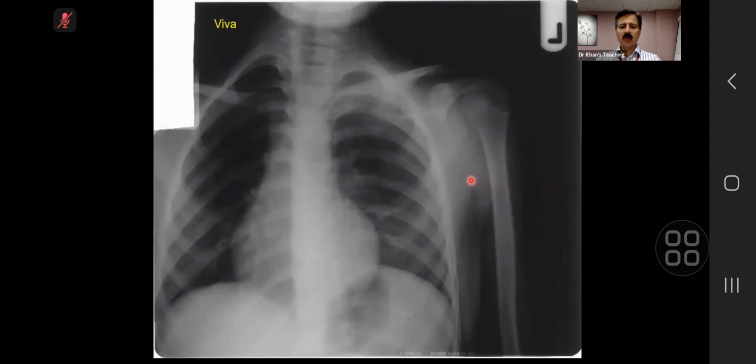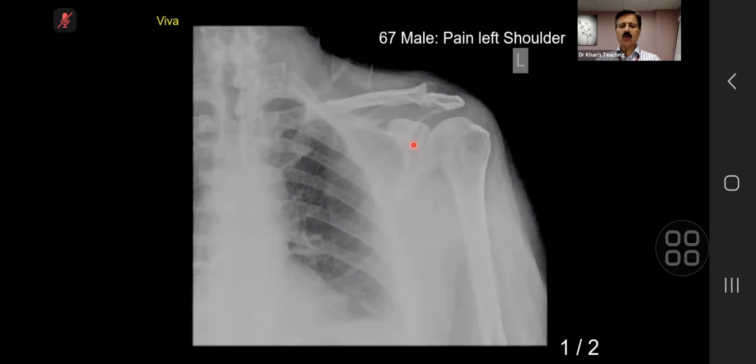This is a case of clavicle periosteal reaction. And the differential will be Ewing's versus infection. This is again an observational film in which this tumor was actually missed by us, and it became a sort of a complaint type of case. If you see here, why I'm not giving it to you, because the resolution is not very good.